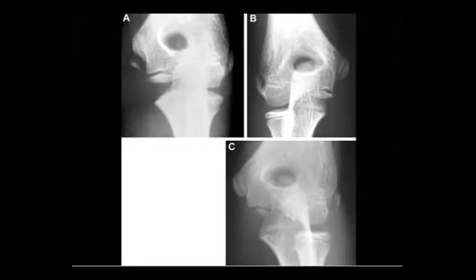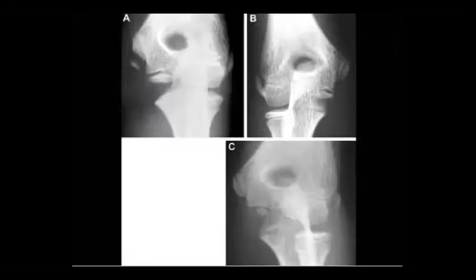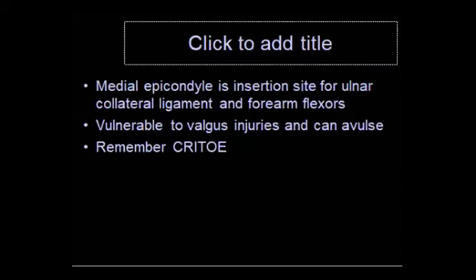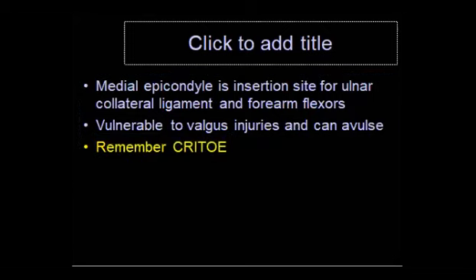I think this one is very important in the exam, to know CRITOE, tension injury of the medial epicondyle in a young patient, acute or chronic, with acute displacement of the medial epicondyle as here. Yes. Don't forget CRITOE, please. They like it in the exam. Very, very important.